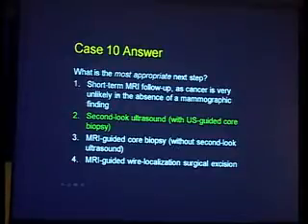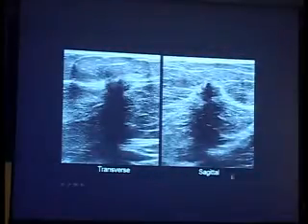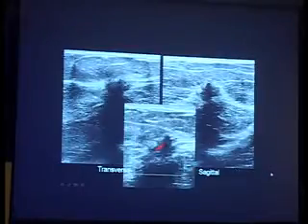Definitely not 1, right? That's a really suspicious finding. Just because you don't see it on mammo, or just because you may agree with me that we don't see it on mammo, doesn't mean that it's not a cancer. It's clearly a cancer. We talked about this paper already, and here is the MRI correlate. Really easy peasy, lemon squeezy. Okay, nice second look ultrasound.